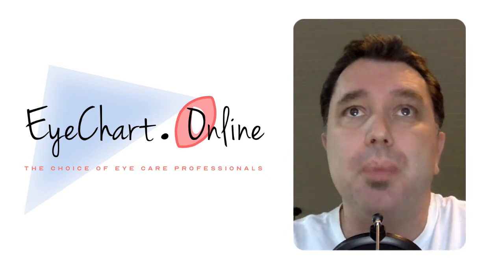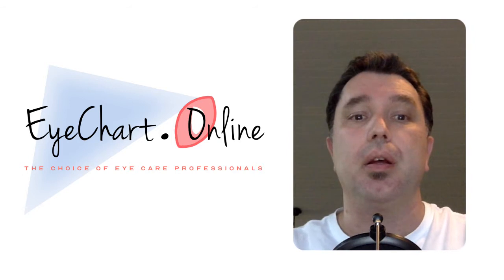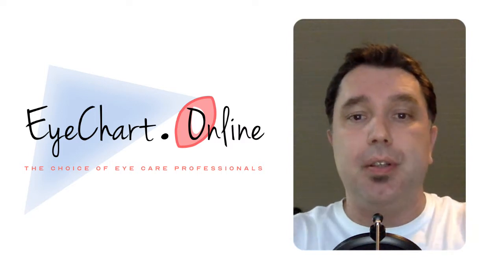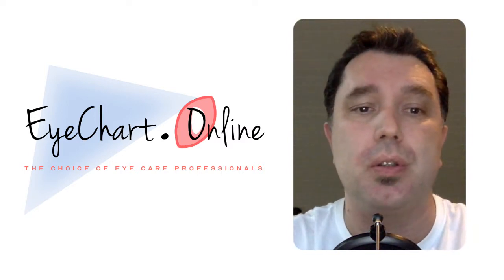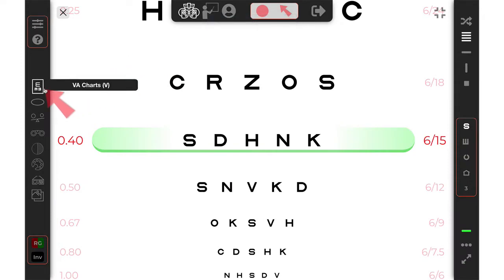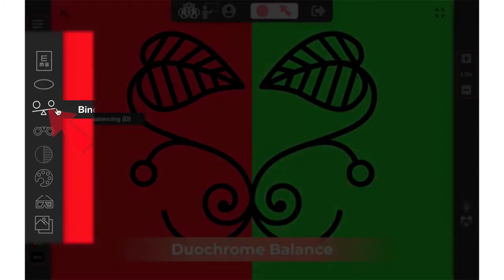A mouse works especially well if you have a dual monitor setup with the examiner monitor in front of you and the patient monitor behind you, and you have a flat surface that you can put the mouse on. In that situation, a mouse works quite well. You can simply change the main chart categories on the left-hand sidebar, like VA charts, Astigmatism Charts, Binocular Balancing, etc.